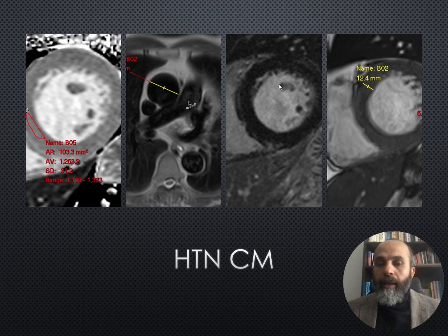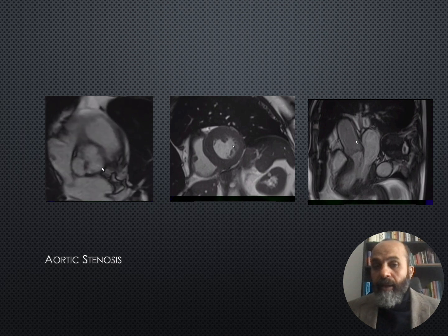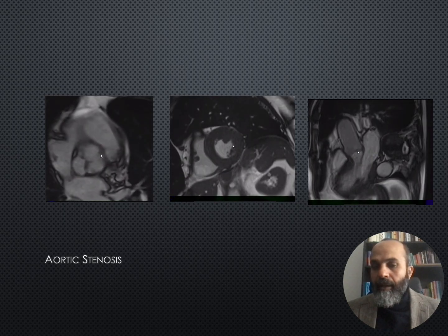Sometimes it shows early subtle changes, elevated T1 maps without even late gadolinium, but on the localizer you find atherosclerotic changes, like dilatation of the aorta, that would guide you in the direction of hypertension. Always check for the valves. Sometimes the cause of the symmetrical hypertrophy lies within the aortic valve, degeneration and calcification causing aortic valve stenosis with jets of aortic valve stenosis.